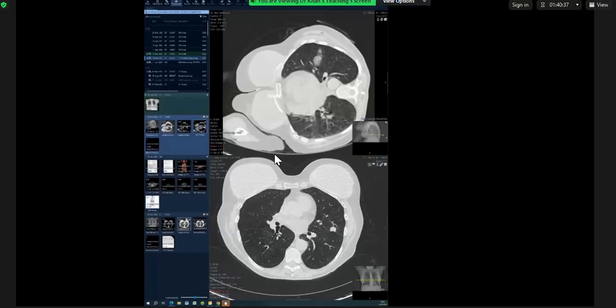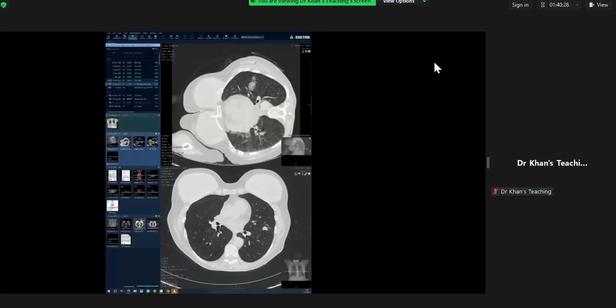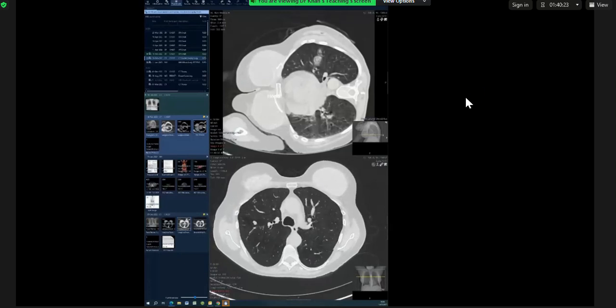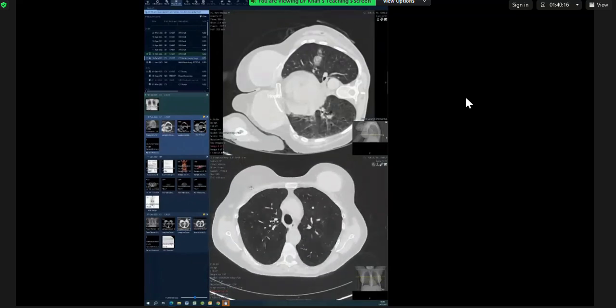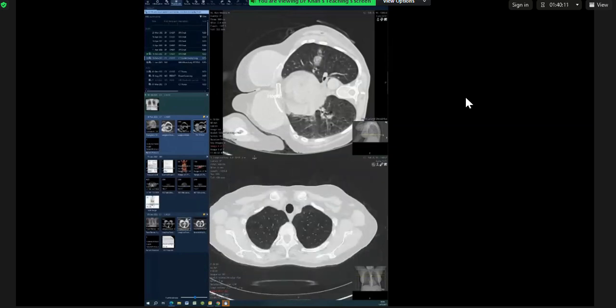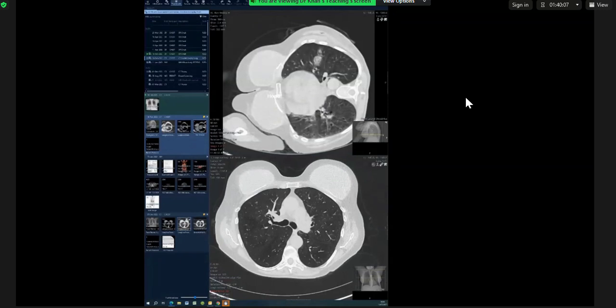So you're suspecting a lung primary, yeah? You haven't said that word so far, primary lung malignancy. If it wasn't a lung primary, your first thought was metastatic from extrathoracic malignancy because they're bilateral. If there's no known primary, you're suspecting a lung primary. Either they're both primaries or one of them is a primary and the other is the met, or he has something in the head, or it's a melanoma or something weird and wonderful. So, like I said, we'll come back to it at the end.